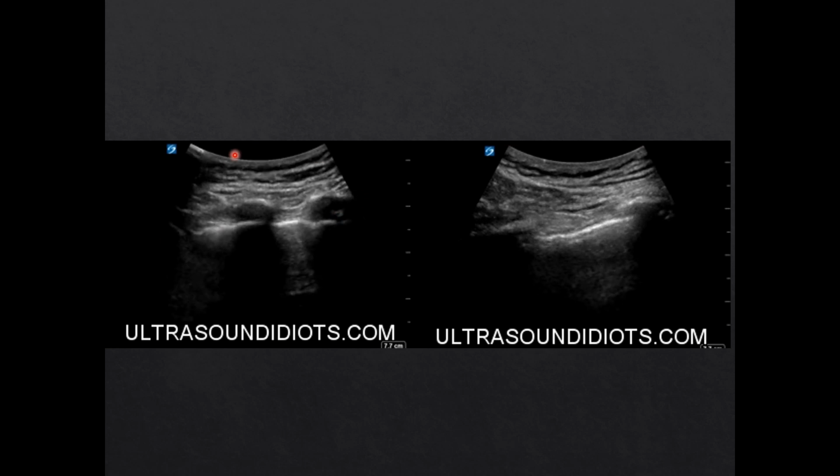On the normal ultrasound, you can see in that pleural line movement that's happening, and you can see that kind of translating down in these areas beneath it as well. And that's because that visceral pleura is rubbing against or rubbing very close to that parietal pleura on the inside of the chest wall. On the right image here, there is no such movement. You can see a little bit of movement down here, but if you pay close attention, this is just a mirror of what's above that pleural line.